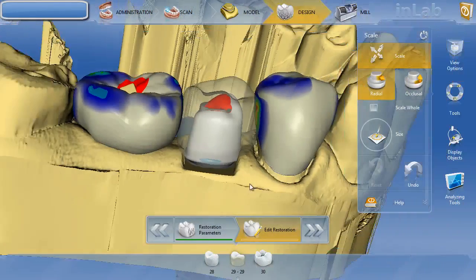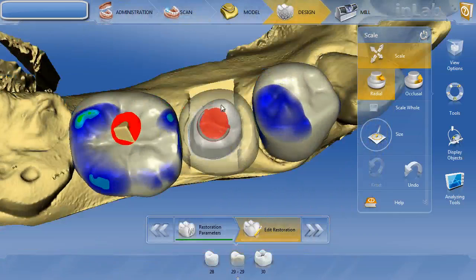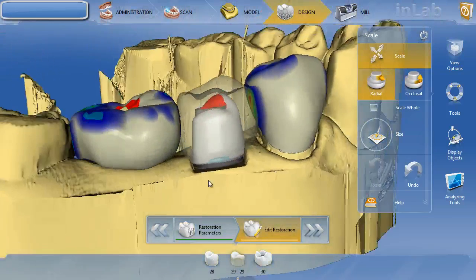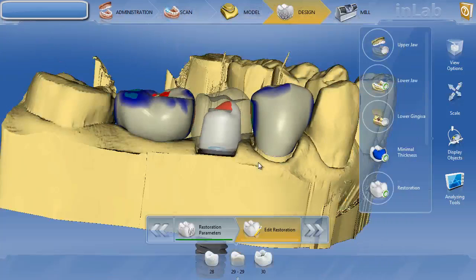Now at this point, you have one or two options. You can kind of bag this system and go to like a Glidewell tie base and do screw retained, or you can go ahead and take your chances on the minimal thickness here. Your titanium base is going to be showing through, and notice it's showing through right where that screw access hole for the abutment is going to be. So you can just go ahead and seat this and then take a burr and manually cut down the titanium base, almost like a virtual reduction coping, so to speak, and that will take care of the problem.